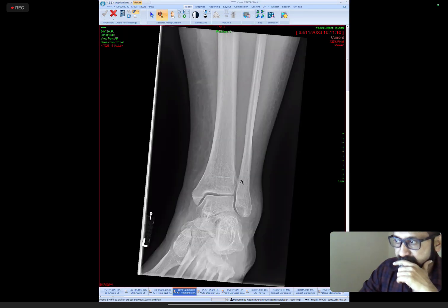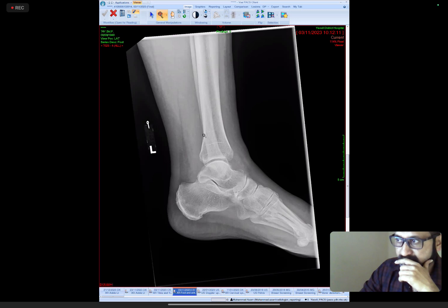We could see here there is a fracture of fibula. This is a left distal fibular fracture, which could be seen here very easily. And you would see some of the images in which you will find AP and lateral view. So don't worry. The rapid reporting trick: usually people say don't overcall, and we don't understand what it means.